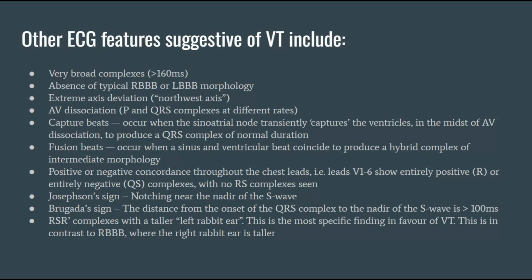Additional features to look out for. Capture beats: normal duration QRS complexes produced when the sinoatrial node transiently captures the ventricles. Fusion beats: hybrid QRS complexes resulting from simultaneous sinus and ventricular beats.